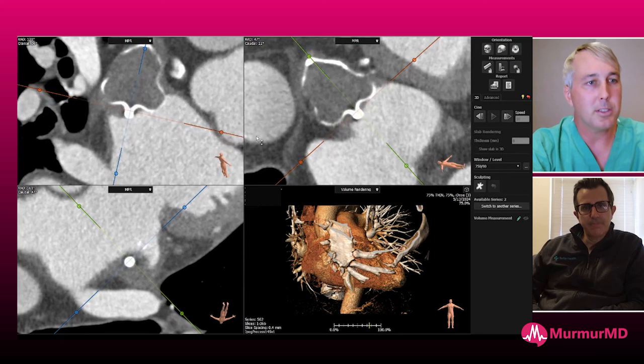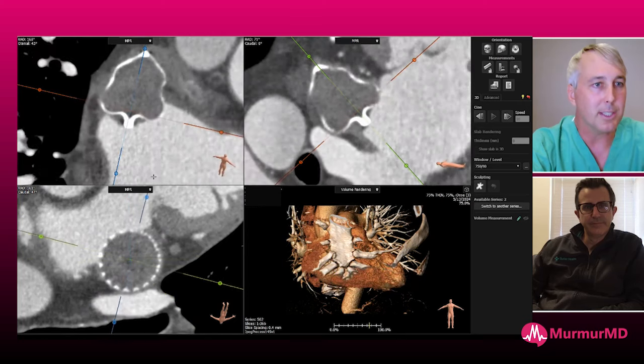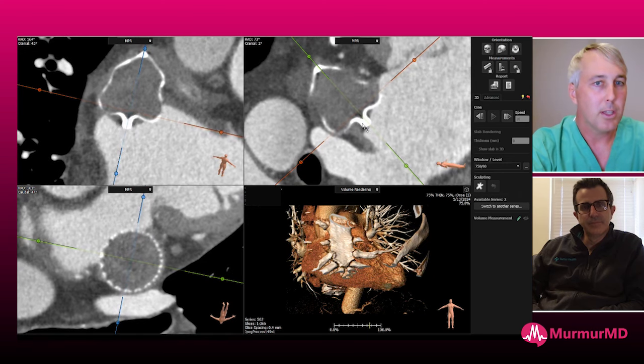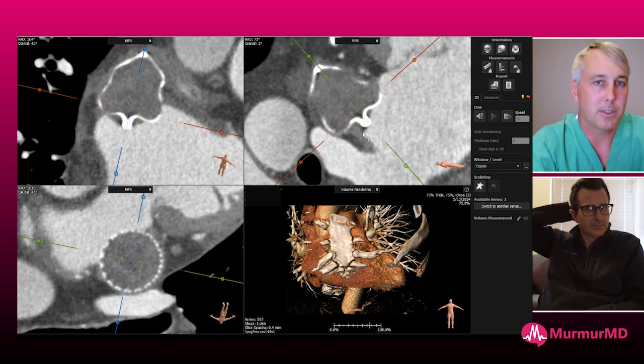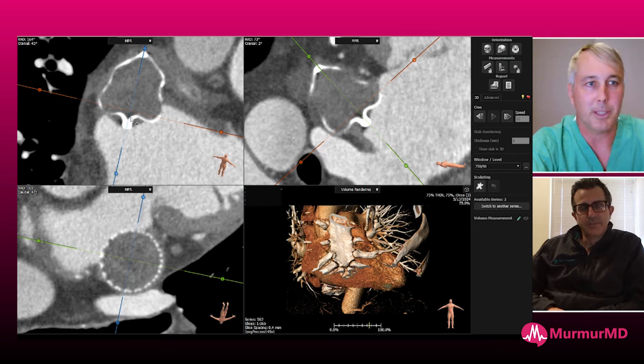Yeah, I mean, does a gutter fill up with thrombus? The way this is positioned, if there was a thrombus, you would see something coming out this way. And this too here, I think is not thrombus. That's outside of the device in the atrium. I think this is the way the fabric is kind of puckered up. Yeah, it makes perfect sense. So this is a common thing that comes up that we see.